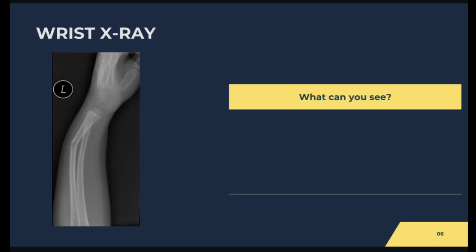So someone has mentioned possible scaphoid injury, and Simon has replied that they're too young to need dedicated scaphoid projections. And then someone mentioned green stick fracture of radius and mid-shaft radial fracture.